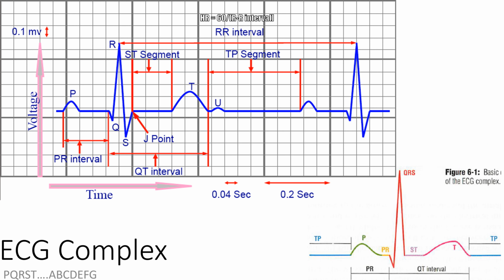All right, so the complex itself, so talk about the intervals that are present, okay? So again, how do you measure rhythm intervals? They're from where to where?